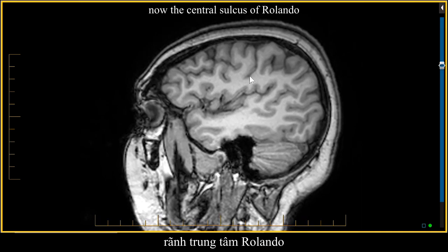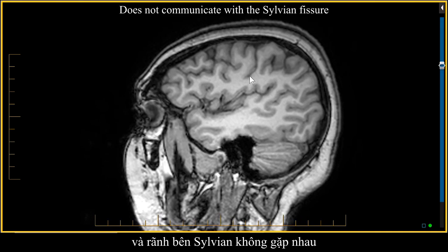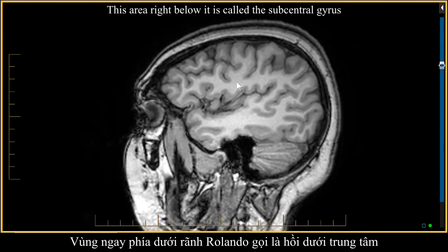Now the central sulcus of Rolando does not communicate with the Sylvian fissure. This area right below it is called the subcentral gyrus.